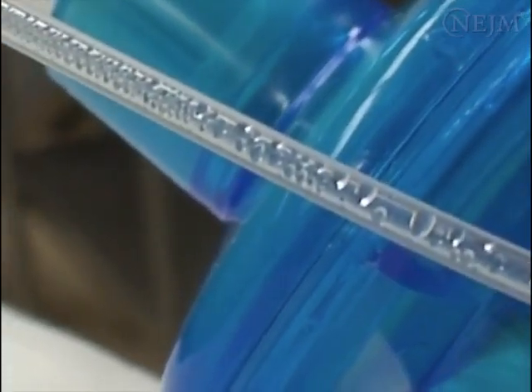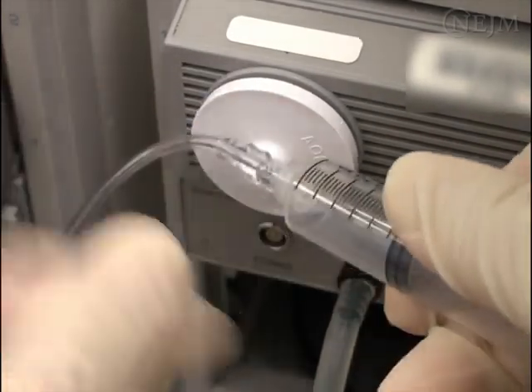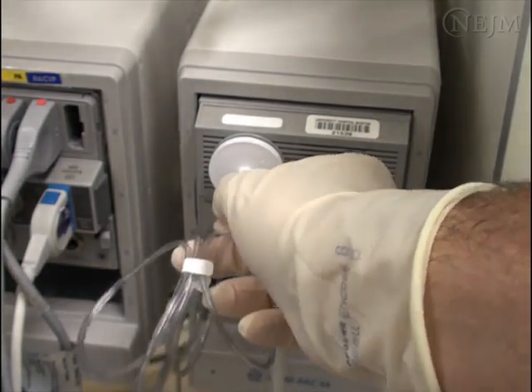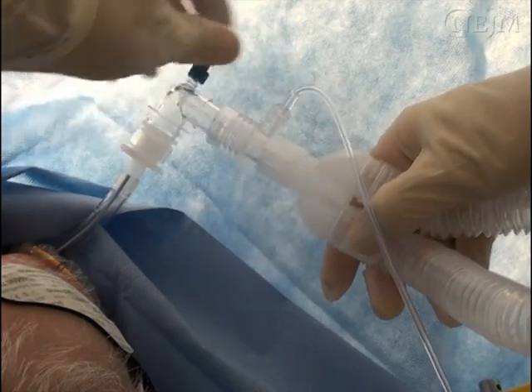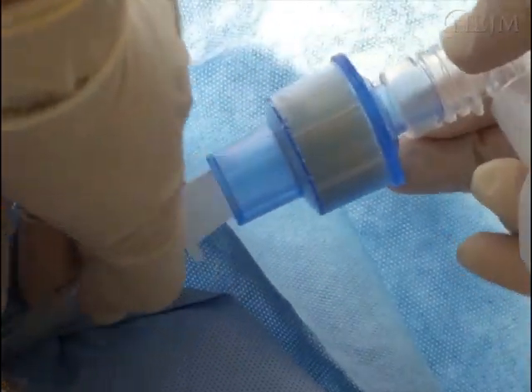The sampling line or water trap may become occluded with condensed water. Disconnecting the sampling line and flushing it with air from a syringe can sometimes clear it, but it may be necessary to replace these components. Elevating the side stream sampling line above the ventilator circuit helps prevent the entry of condensed water. A humidity barrier is also useful, although this will increase the response time of the capnogram.